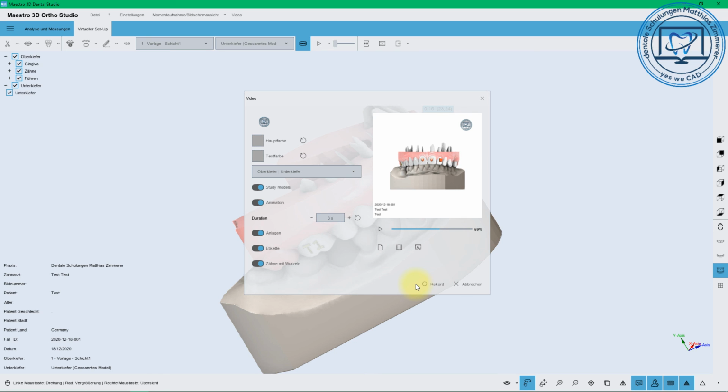If you have a face scan also, it would be shown here, very cool, but at the moment I'm using Android, and the Bellus app is only working on iOS, so the other things are too expensive for me at the moment, so I won't use face scans.